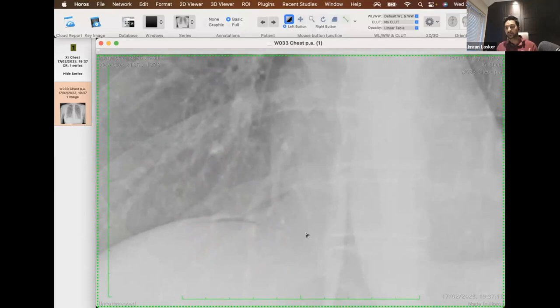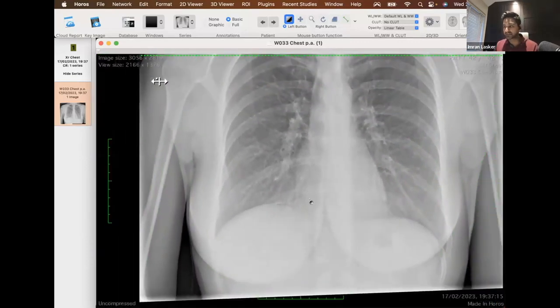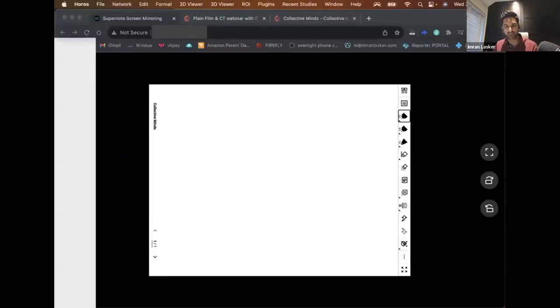But if you've got someone who's come in and they've not had any surgery and they look like this, then you've got to be concerned there's some sort of gas-forming problem here. So either it could be a perforated intra-abdominal viscus, i.e. bowel, or it could be a gas-forming organism. I've seen this kind of thing happen with emphysematous pyelonephritis, emphysematous cystitis, abscess formations that happen as a result of a perforated diverticulum and all that kind of thing. So yeah, it can be post-operative, but that's why the clinical history is so important in all of these situations.